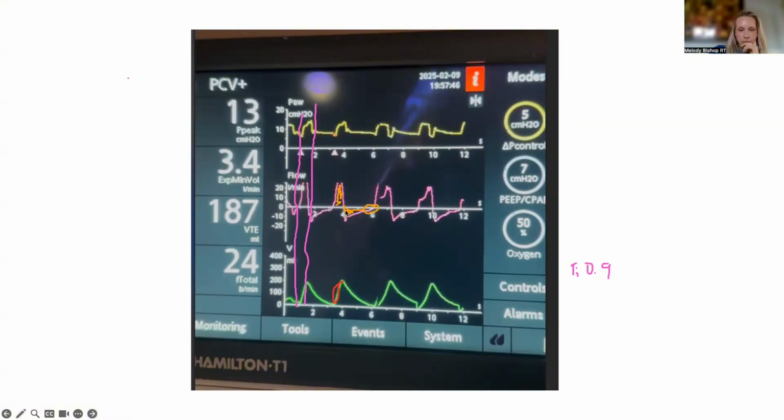This is interesting too. So, this peak expiratory flow, and then instead of this nice exponential decay to baseline, you don't have that. It almost looks like there's a differing time constant from the peak expiratory flow to when the flow starts to exit the lung, right? It hits this, boom, and then it just stays straight. So is the patient trying to breathe out? Does that mean there's some obstruction that's causing that pattern? I think there could be.